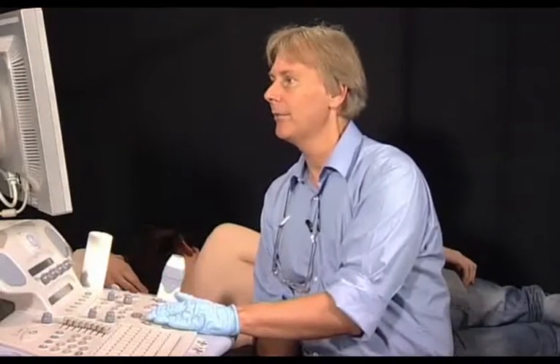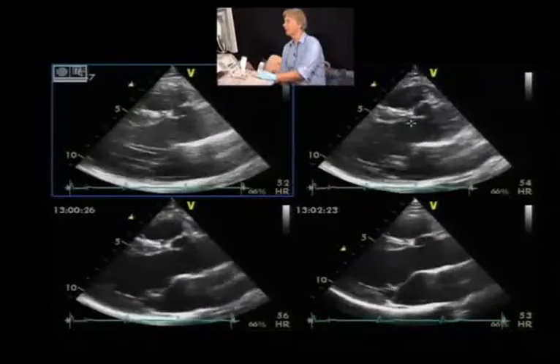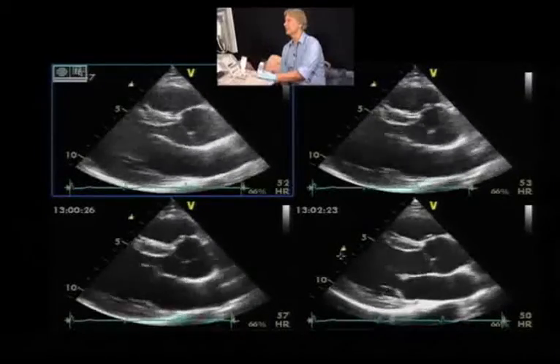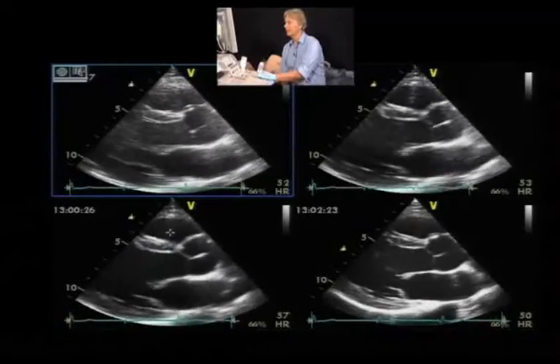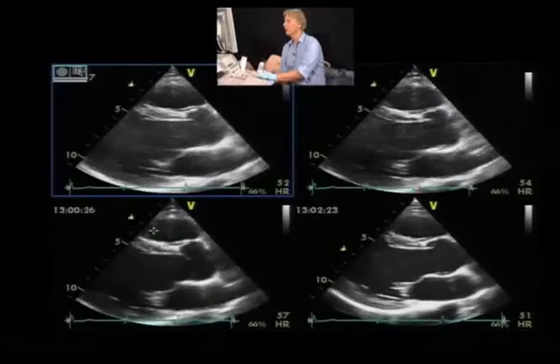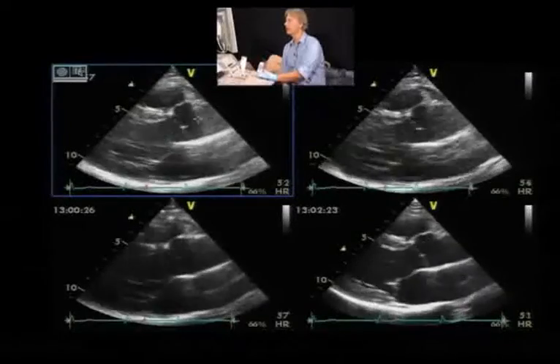Harmonic and fundamental imaging give us a bit of a different characteristic of the image. Here's an example. On the top, we have two different frequencies of fundamental imaging, and on the bottom, we have two different frequencies of harmonic imaging. You can see that with harmonic imaging, usually the cavity and the heart chambers themselves, or the inside of the chambers, are dark, while with fundamental imaging, we have more artifacts or speckles within the image.